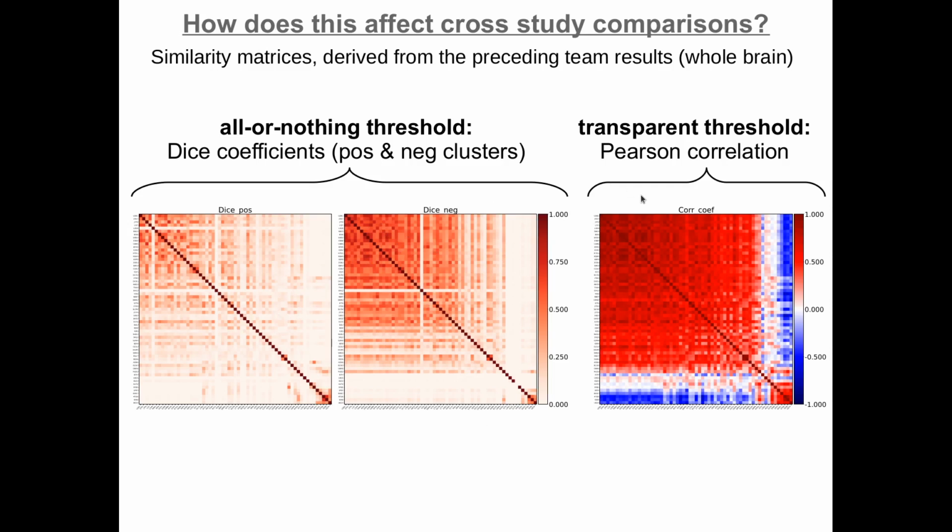When you compare the results in a way that's consistent with the highlighting method, the transparent thresholding, so you look at a correlation of the brain maps, a spatial correlation, what you see is there is a huge chunk of data that actually agrees in terms of correlation. Those hot-cold patterns are consistent across a huge fraction of the group. And what do we see? There's also this other group, highly correlated amongst themselves, but anti-correlated to the bulk of the group, other subjects. This is simply that set of subjects that probably has a sign difference or sign mistake.